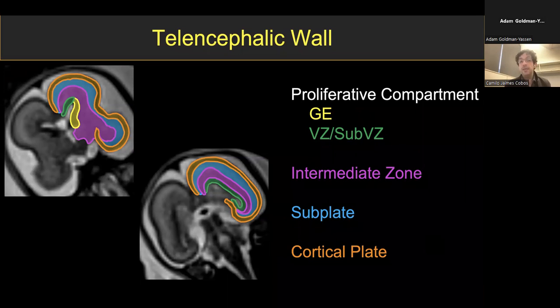However, as our fetal imaging has gotten better and better, we are able to see the lamination of the brain. And that is very, very important. We're using it more and more to diagnose diseases early, particularly localized injuries or malformations at earlier stages. So I've colored them so that we can have an informed conversation about them, going from inward out.